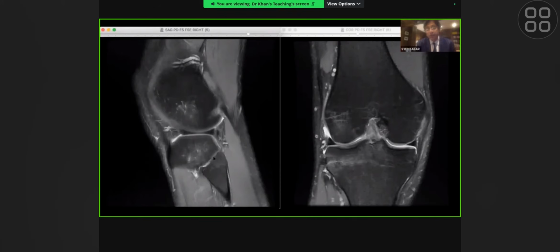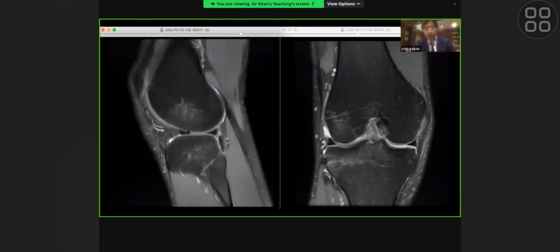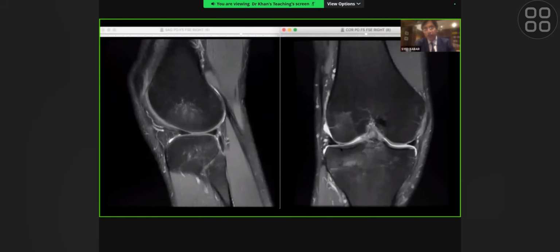So you can straight away tell that there's damage to the ACL. What extent, we'll come to in a second. At this point, I also cast a quick eye on the lateral meniscus. Now, as Dr. Butt was telling you, you can see a nice triangle of the lateral meniscus there, except for a little cleft here, which I'm not sure about at this stage. But remember, we've got a coronal sequence at the same time on the other side of the screen. So let's just have a quick look at the coronal to see if there's anything there.